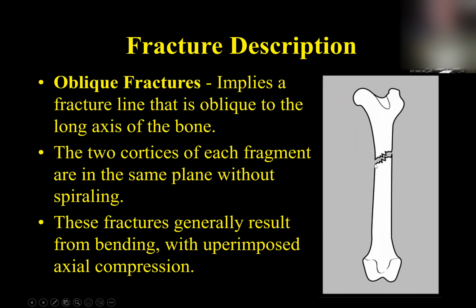This is an oblique fracture. It's a complete fracture because it goes through both cortices, but now it's not straight, parallel or perpendicular to the length of the bone. It goes at some oblique angle. Sometimes these are short oblique fractures like this one. Sometimes they'll start here, but they won't exit till down here. And those are long oblique fractures. Okay, so that's just an oblique fracture.